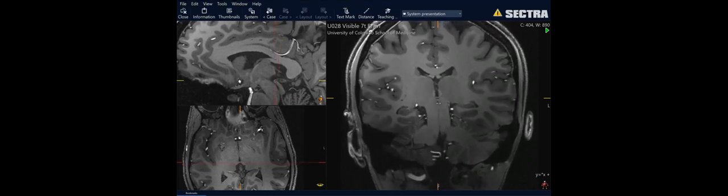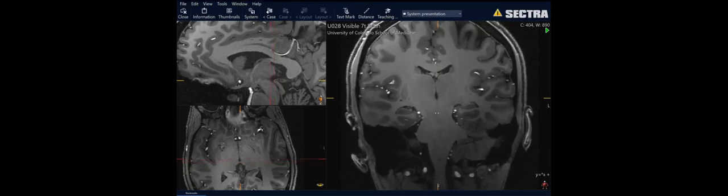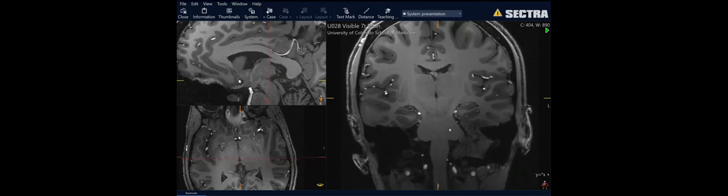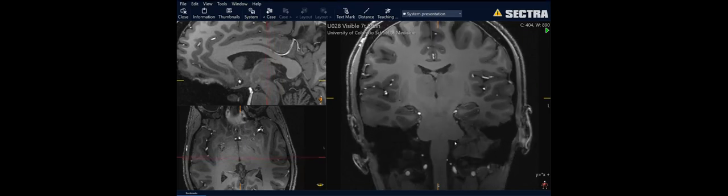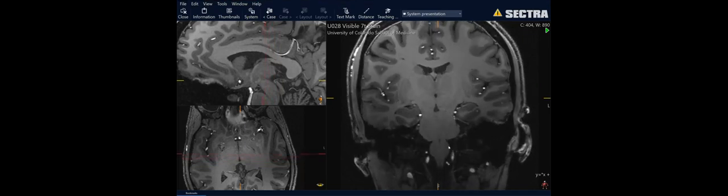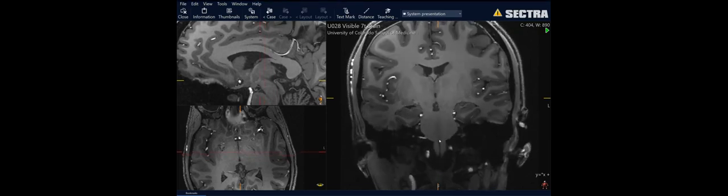And as we make our way a little bit more anteriorly, we can assess some more of those brainstem structures, and we can see pons and the middle cerebellar peduncle. As we work our way anteriorly, you can see at that pontomedullary junction, we've got cranial nerves emerging here, possibly facial, possibly vestibulocochlear. You can make out the inferior olivary nucleus, that bulge laterally.